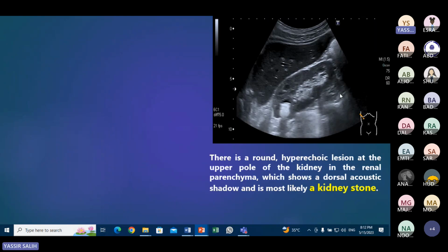What is this? Ultrasound of the kidney. Yes. What do you see? There is a stone that appears hyperechoic. Yes. With a stone, always don't miss the shadow. Don't forget the shadow. Any stone is hyperechoic with posterior shadowing; wherever you see a hyperechoic focus, look for the posterior shadowing. This is hyperechoic, so this is the renal stone or kidney stone.